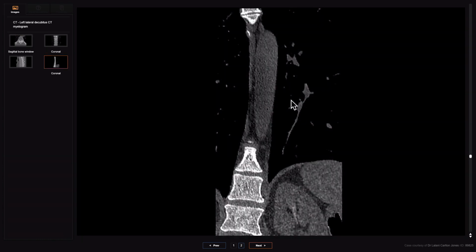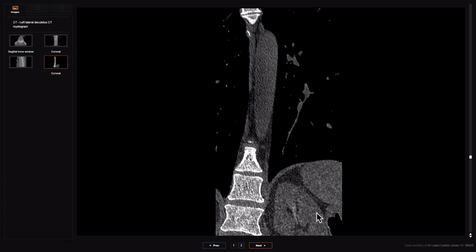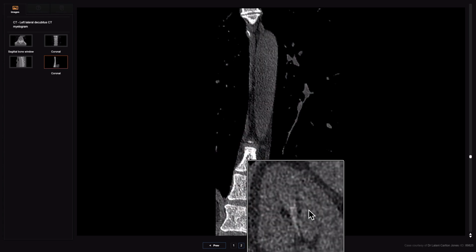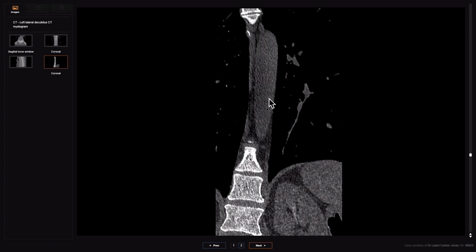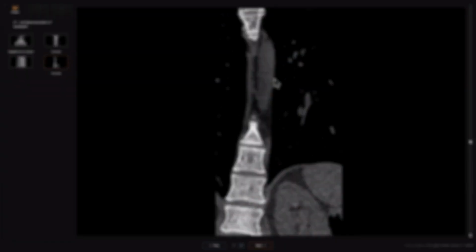Now, an important finding that we should look for if we haven't seen anything is one of early renal excretion of contrast. So here we can see that there's renal pelvis accumulation of contrast, which has occurred within really only a few minutes of injecting the contrast. And that's an abnormal finding. You shouldn't normally see this early renal excretion with myelograms done for other causes. So if you haven't seen your CSF venous fistula, but you have that finding, then go back and carefully scrutinize every image and look for that CSF venous fistula.